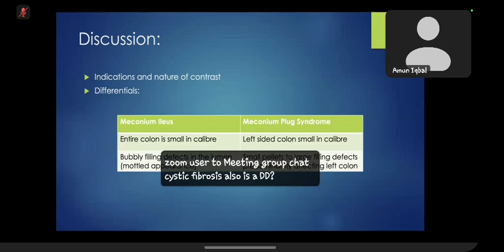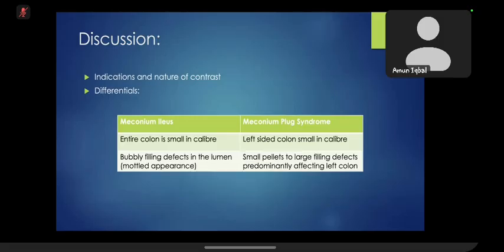We will give oral barium. We'll see if the small bowel loops are also dilated. Also, an X-ray can help us see whether there is any dilatation of the small bowel loops, because if ileal atresia is suspected, that means the small bowel must be dilated. We need to exclude that. Then we need to exclude total colonic Hirschsprung disease or total colonic atresia. And for that, we need to arrange with the surgeon or the primary physician to do a rectal biopsy. Okay, so this case is done.